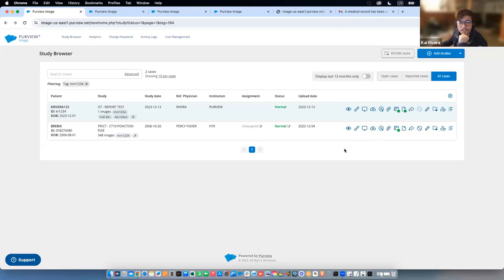Here's another question. If you accidentally close the patient file by clicking on mark as read, is there an easy way to reverse this so that the report becomes active again? That's a good question. So right now, that is an active feature request.